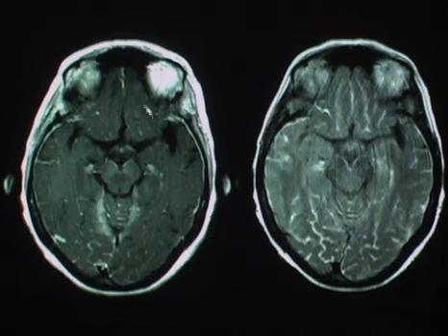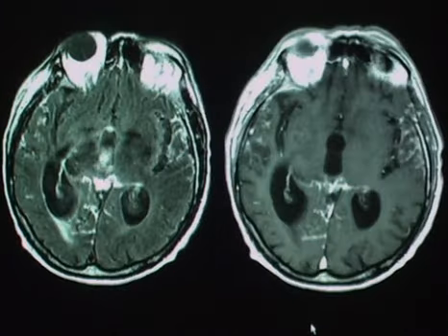A little more conspicuous example here, the post-contrast imaging on the left demonstrating increased leptomeningeal enhancement seen posteriorly, also in the basal frontal lobes, and also some thickening of enhancement along the dural margin at the tentorial margin with some increased enhancement at several cerebellar sulci. What we see on the FLAIR imaging is that it really brings out the signal abnormalities in all of these regions, and that we see it here posteriorly to a greater degree than what we're seeing in the routine post-contrast imaging.